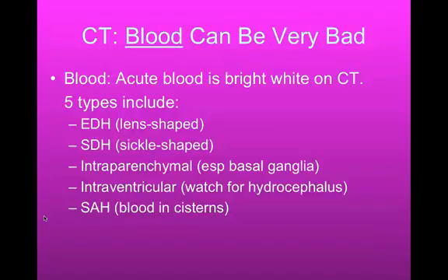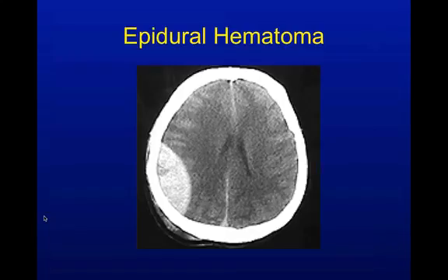Okay. So we'll go through lots of images here in this next section. I'm glad we've got the lights turned down a little bit. So for that first piece, blood, we're going to look for epidural hematomas, subdural hematomas, intraparenchymal bleeds, intraventricular bleeds, as well as the subarachnoid hemorrhages, the other stroke. Okay, so let's just jump right into that, with lots of images. In the original version of this, it's normally about an hour-long lecture. I don't give the answer at the top of the slide. I make you think about it, but we're not going to have time for that.